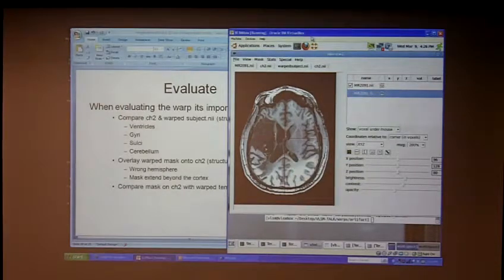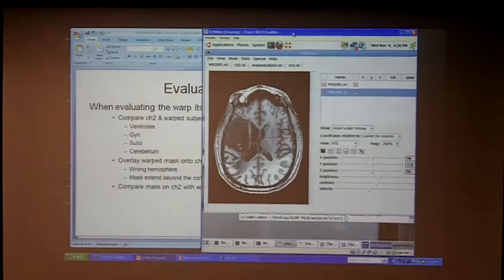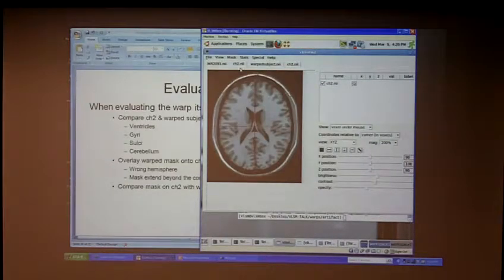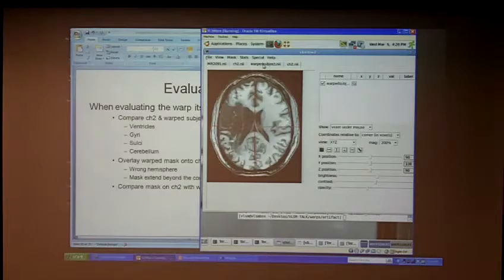So what I have here is one subject's warp, what I would consider to be a larger lesion. Not the largest that we've tried to warp, but a reasonable, good-sized lesion. You have the Colin template, the Colin brain. So basically, this is the subject, and we want to get to Colin space using ANTs. This is an example of how one of our warps goes. This one is not the best possible warp, because you can see.